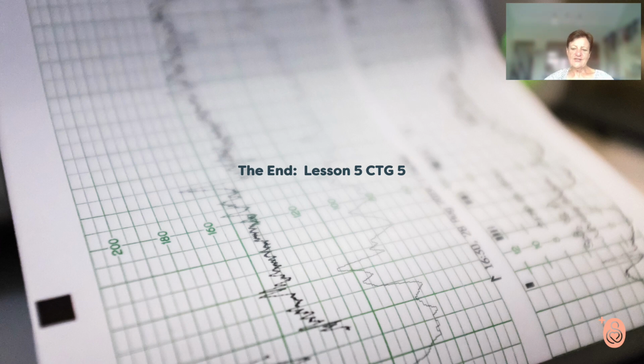And that brings us to the end of your interpretations of the CTG. I hope that by this time you know CTGs now from front to back. Go well.